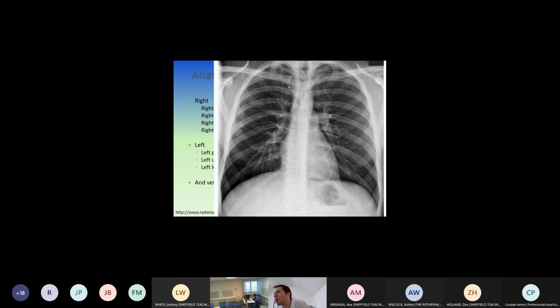A lot of people get hung up on these little indentations here and at this side here. And that's not a rib fracture. We don't often see rib fractures in adults posteriorly where they insert into the spine.